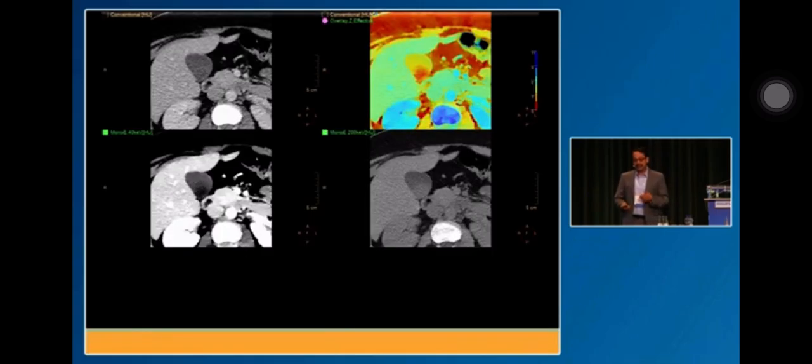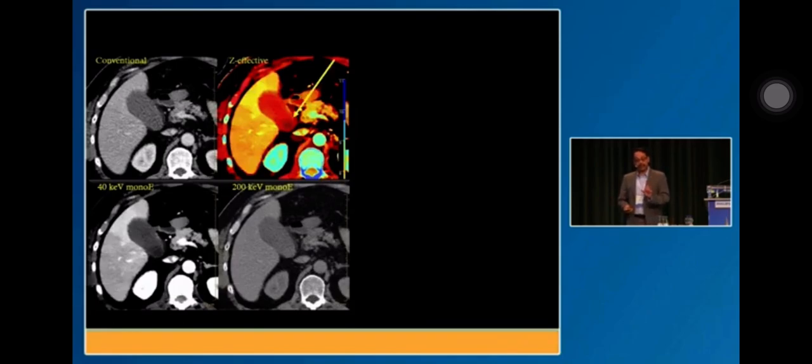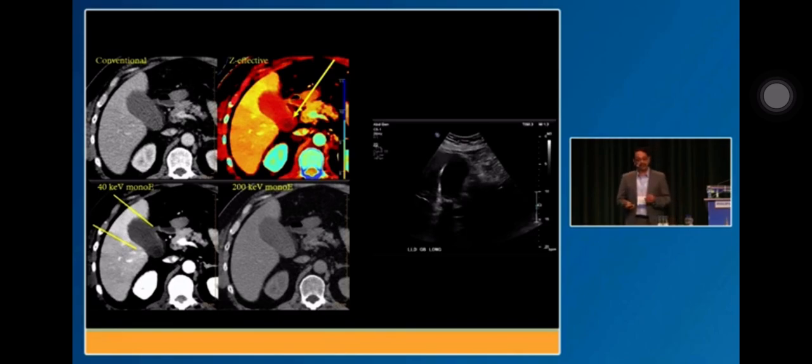Spectral CT is really good for picking up radiolucent gallstones, and this is because the attenuation of the spectral curves of bile and gallstones are very, very different, even though they look identical at 70 keV, which is where you obtain conventional images. In the setting of acute cholecystitis, not only can you pick up the radiolucent gallstones, but you can also pick up really nicely the hot rim sign and help you make the diagnosis with confidence. Now, the ultrasound in this patient is actually kind of unimpressive. In the US, I don't think ultrasound does that great for acute cholecystitis for a whole host of reasons.